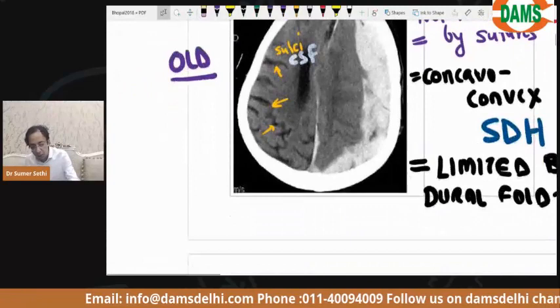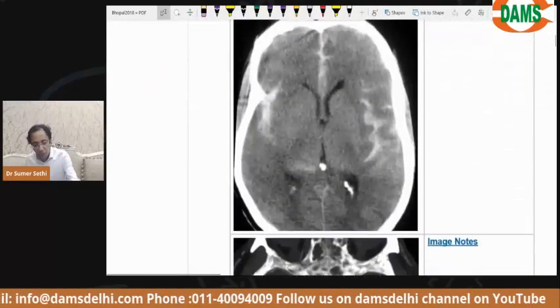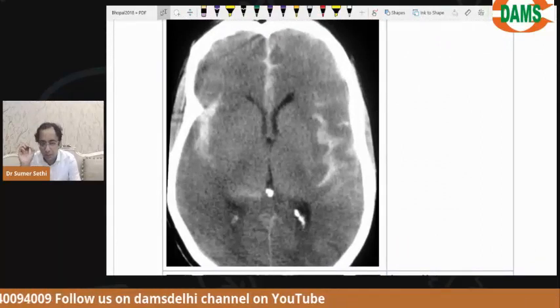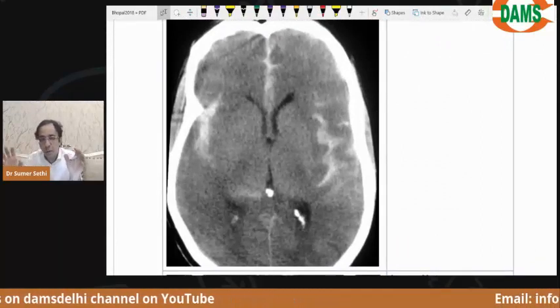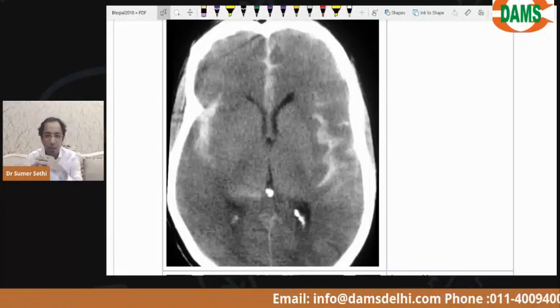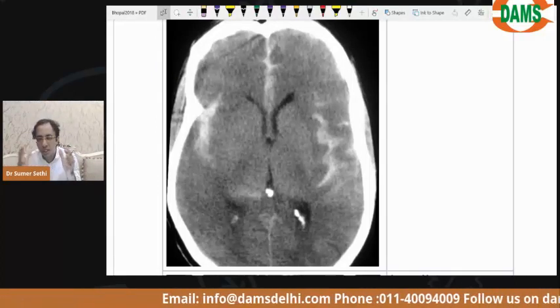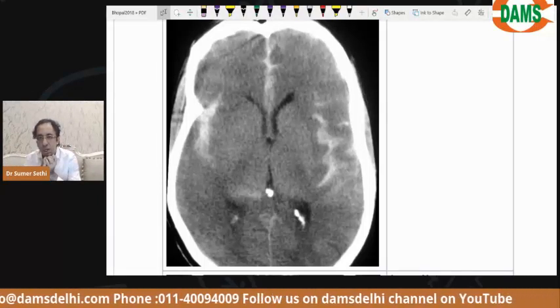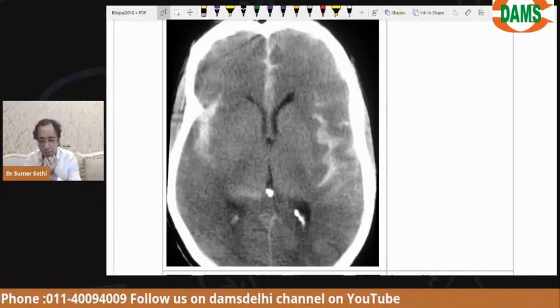I can see most of you are able to answer. So if you are able to answer, try telling me the problem in the next picture. Now you can see, before the break, I was only telling you anatomy. Now I'm showing you diseases. My goal here is to make sure that you understand the anatomy and the disease both. Now look at the image and tell me, where is the problem in this image?